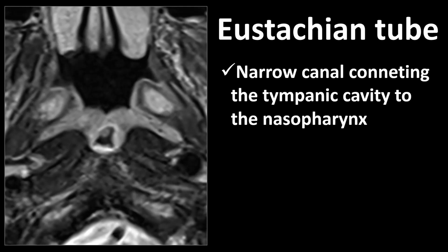But what is more important, you will often see that the Torus Tubarius has this very hyperintense component on T2 weighted images, which even further helps you to detect the Torus Tubarius and to visualize it.